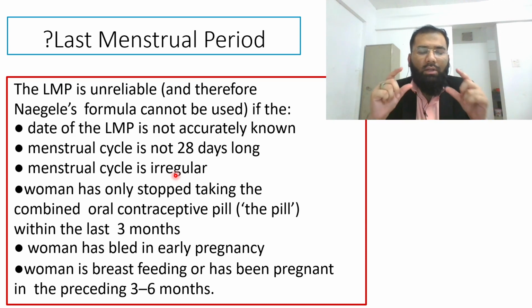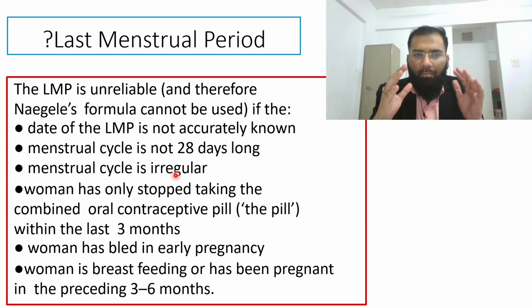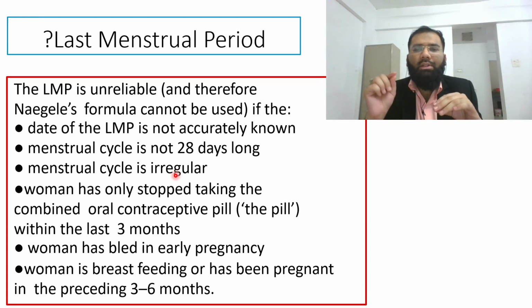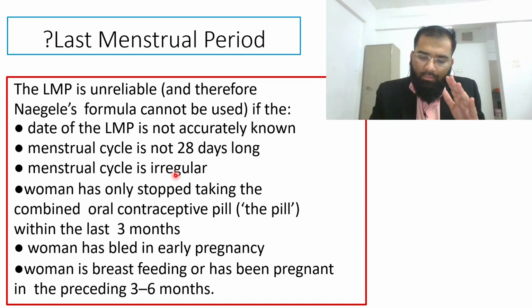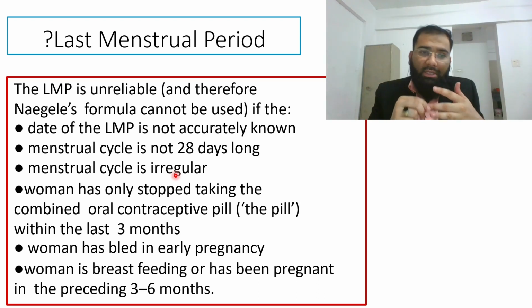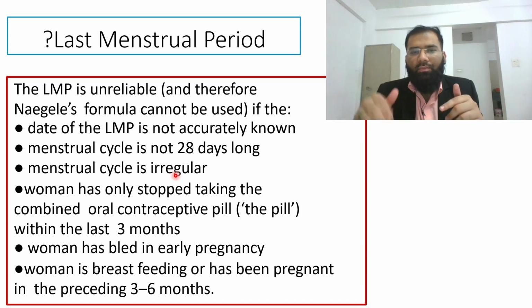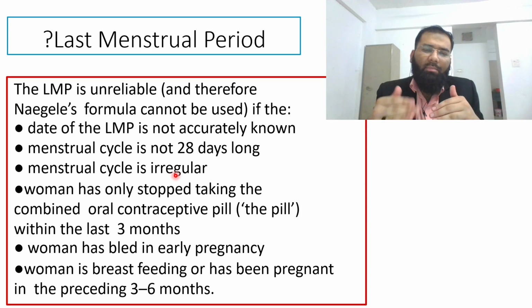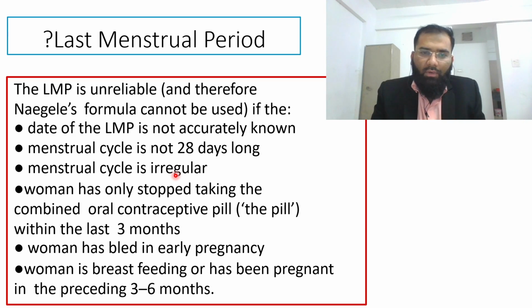Over there, your early ultrasound, that is the first trimester, the earliest ultrasound becomes an important determinant of the fetal gestational age. This first trimester scan is not only important to find out whether the female is pregnant, but it is also important to date and provide the EDD. This EDD and this date will be used further when the patient subsequently comes to you in the second or third trimester, again for ultrasound, for follow-ups to monitor fetal growth.